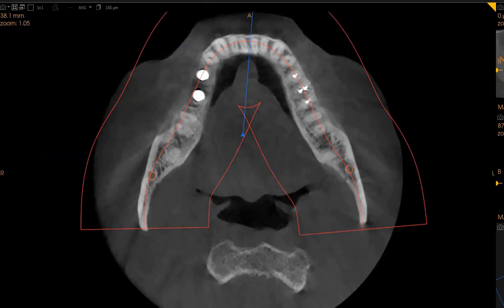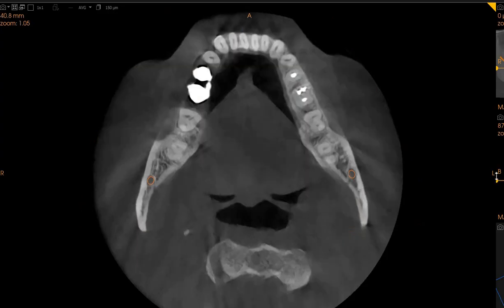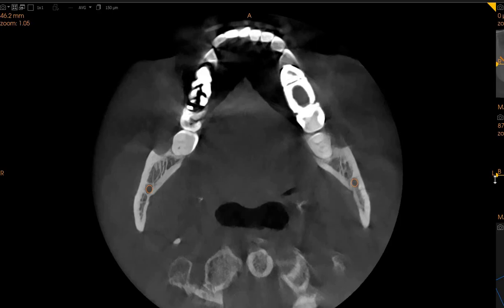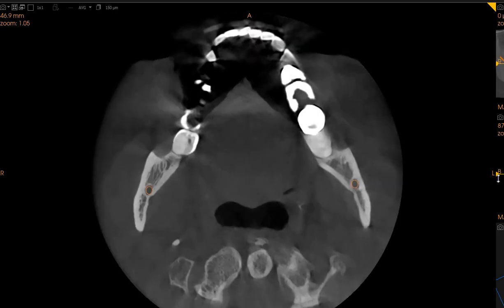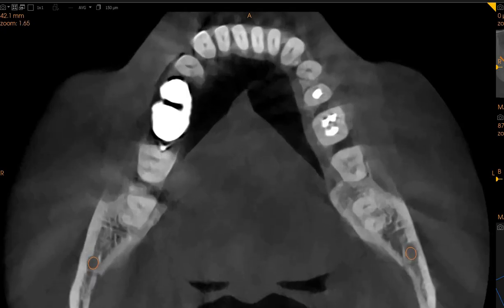So this is the CBCT of the patient which you had requested. The area of interest is lower right, upper right for posteriors for fracture evaluation. This is going to be considerably difficult because we need to know exactly which tooth is in question or which tooth the doctor is suspecting as to be the problem.